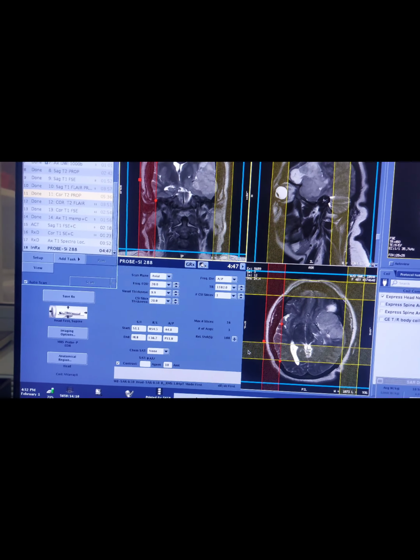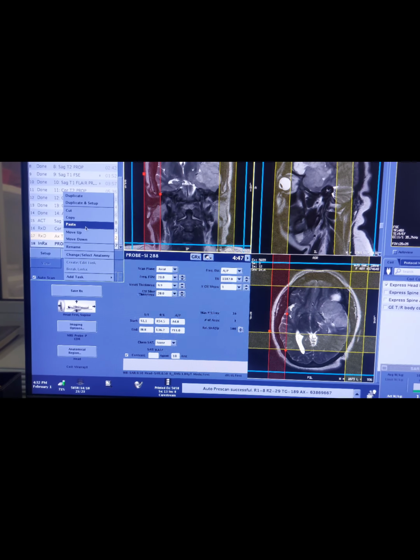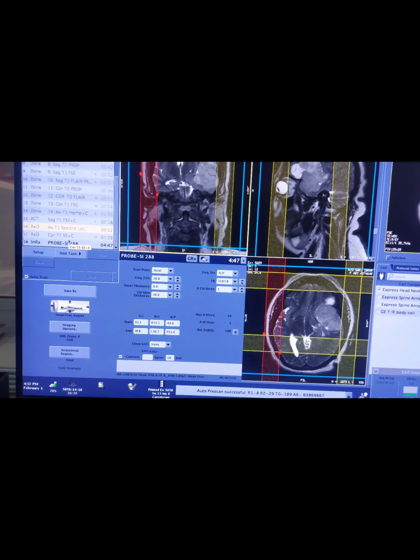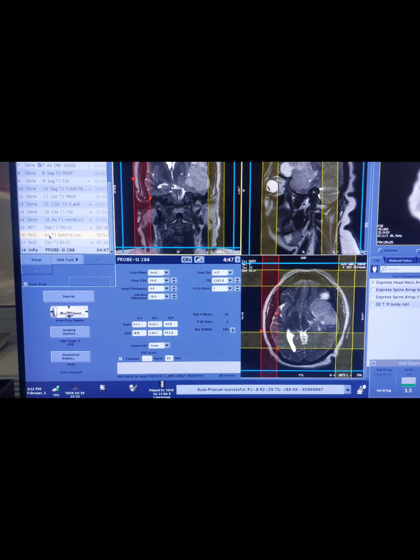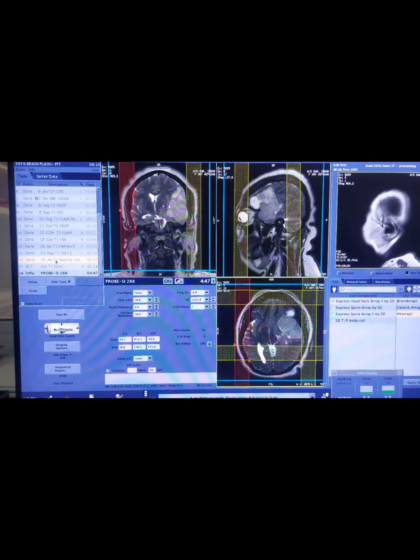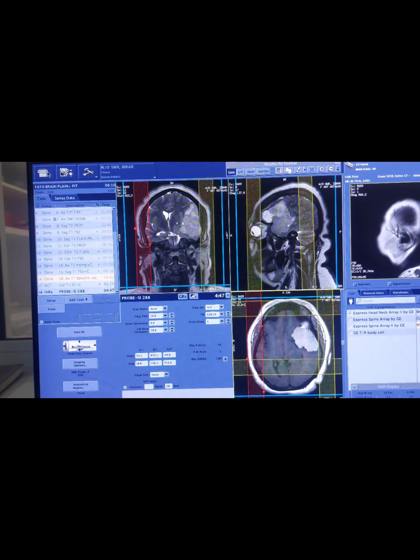The reason that I used post contrast spectro is that this gives the exact size of the lesion, excluding the abscess or fluid area caused by the lesion. So here we have the T1 post contrast localizer for spectro. As you can see, the difference of the lesion is visible in the others also.